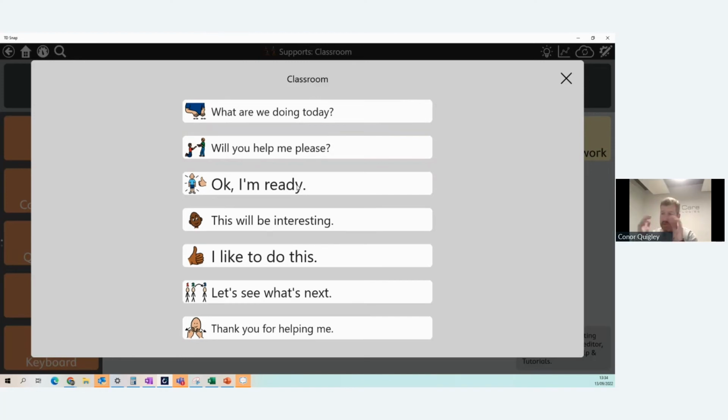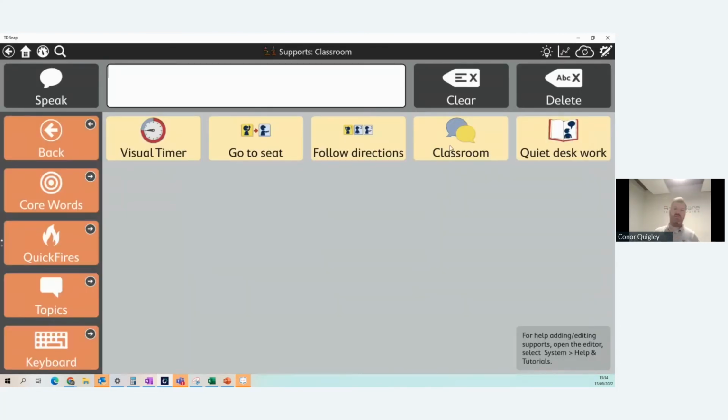Just a really quick script where the user can say their message and they're starting to use their AAC device outside of that immediate support group. We can encourage that engagement. So I've seen people set up scripts for bus drivers or taxi drivers, or with older users, they may go to the shop to buy something, so they might have a script set up in that instance. So they're your behavior supports, and again, go mad on editing and supporting them.